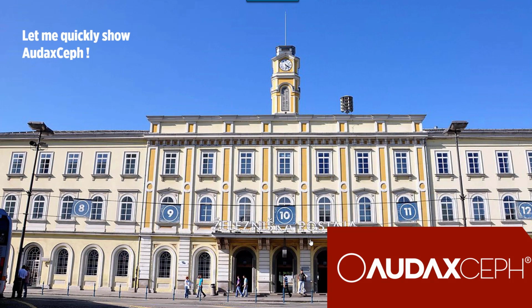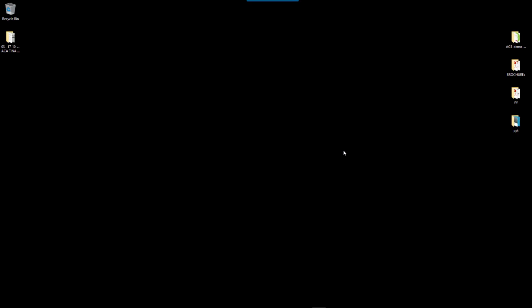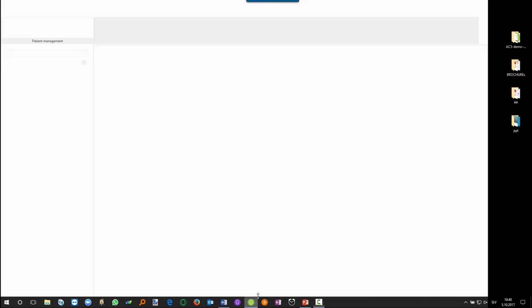Okay, it's probably the time to show AudaxCeph and its major functionalities to keep this webinar away from being dry as a bone. You see Ljubljana railway station, so let us go for a ride. In the next few minutes, I would like to show a majority of functionalities inside AudaxCeph. I've already started the software.